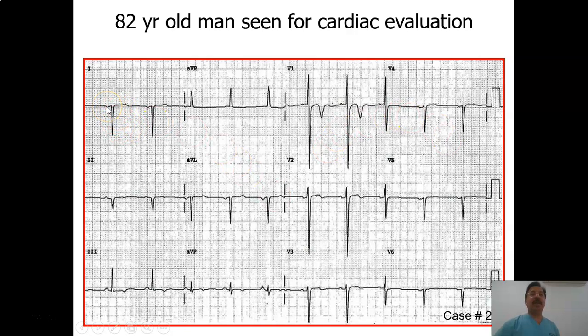Another is the junctional rhythm. So here it is not a junctional rhythm. And the third possibility is dextrocardia. So if you see dextrocardia, it looks like this is V1, V2, V3, V4, V5 and V6, as if the ECG is recorded from the right side of the heart.